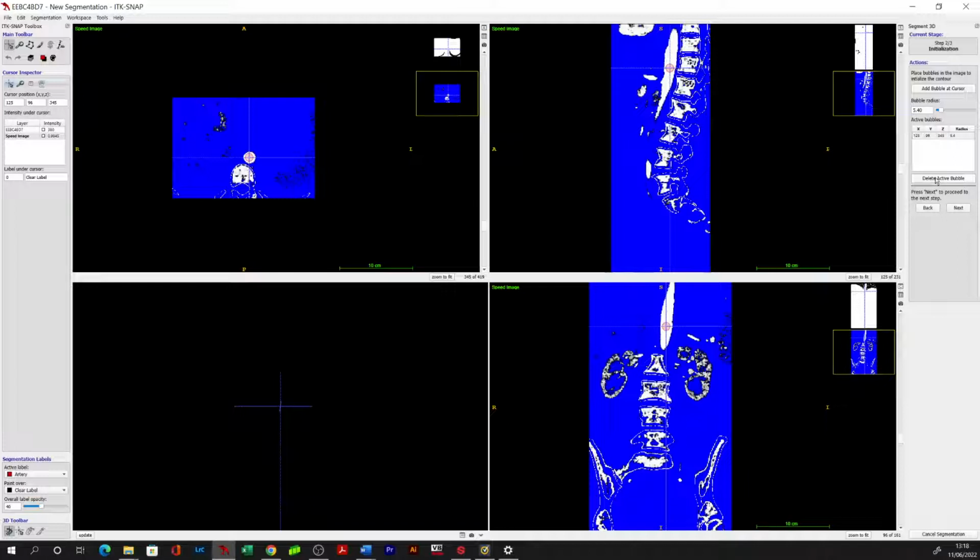I would also advise that if you've done a lot of existing segmentation already, so the classic example is you've done all the vessels on a CTC and then you're going to automatically segment the colon using this method, definitely save it before you do so, because there's a number of times where this has crashed and I've lost an hour and a half's worth of work. So that can be quite frustrating. So if you're doing this after having done existing segmentations on other structures, definitely save beforehand.